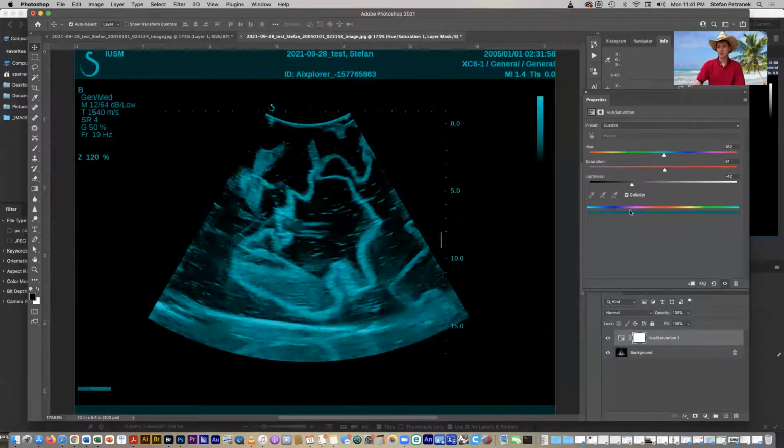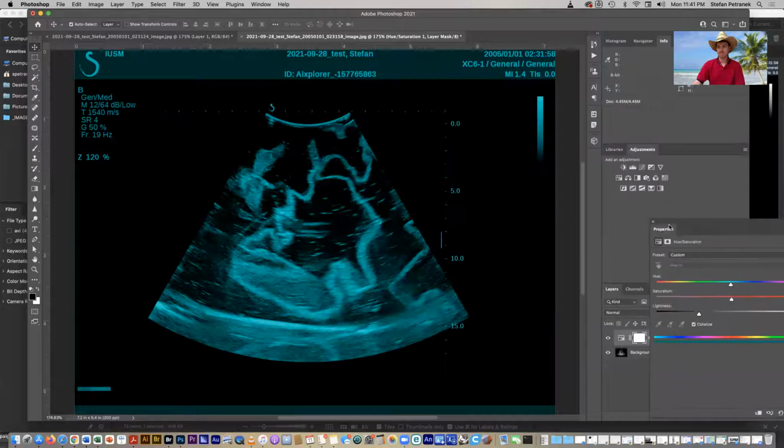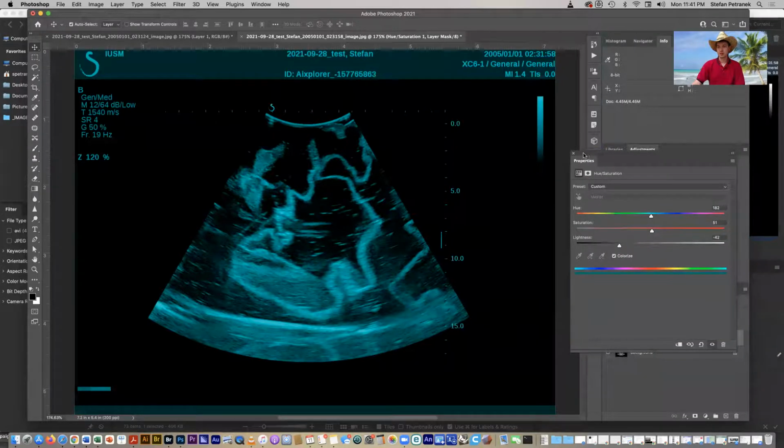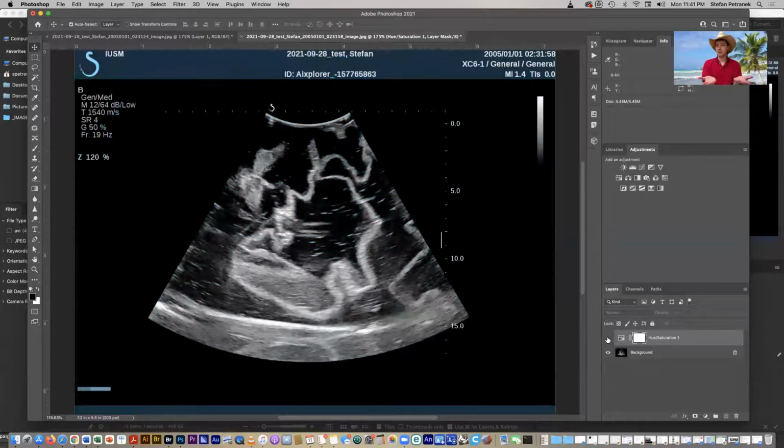So this is my little Properties box, but I'm going to put that right there. So close that up so you can see everything again. Now, I made this on an adjustment layer, which is nice, which means that there are little eyeballs, and the eyeballs indicate that it's on or off. So if I click on the eyeball, I turn it off and get back to my original, right?